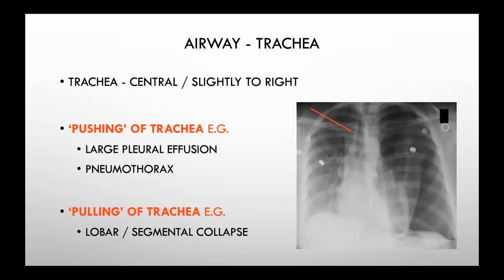Now, a lot of people will say this chest x-ray never should have been taken. I would amend that by saying if this patient were hypotensive, it never should have been taken. So if they're showing signs of a tension pneumothorax, then don't do the chest x-ray. Obviously, you'd book one, but in reality, this is a hypotensive patient. He needs a grey cannula in the second intercostal space, midclavicular line.